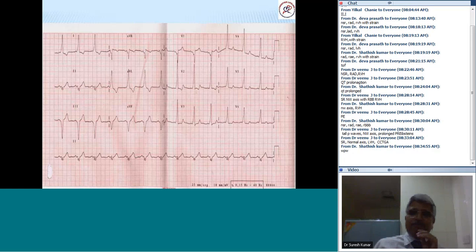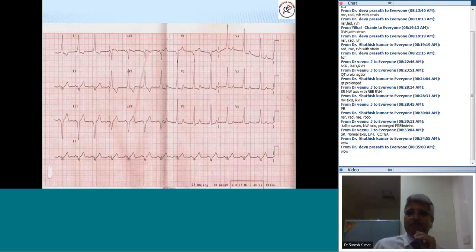Good, Satish. It is WPW, but can you go further from there? At least more people are spotting the WPW. Where is the accessory pathway? Is it in the right ventricle or in the left ventricle? At least that much you can say. You may not be familiar with that concept.